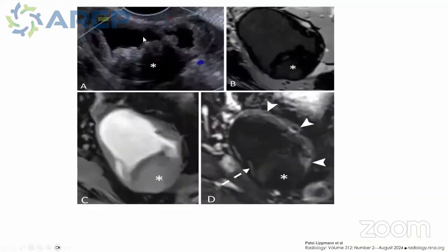A similar lesion, it's a solid cystic lesion on ultrasound with shadowing. On T2, it has a solid component. It's intermediate signal, it's a mixed signal actually. There's hypointense and intermediate signal as well. On T1, the fluid component is hyperintense. There is a septation here.